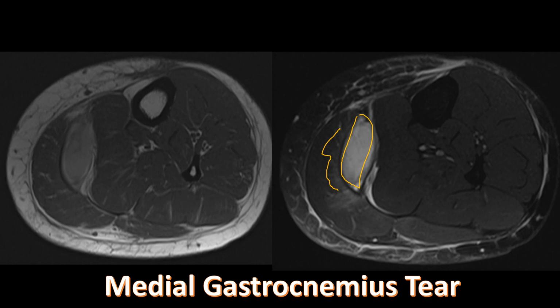We used to think that this was related to a plantaris tear because of the blood between the muscles, but we now know that the overwhelming majority is related to a medial gastrocnemius tear.